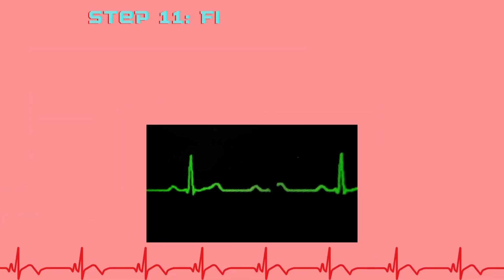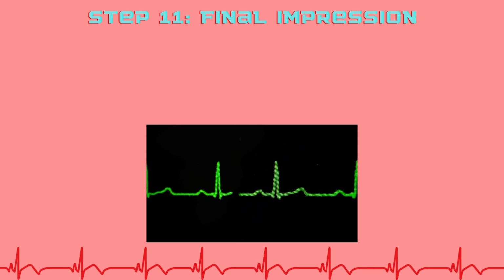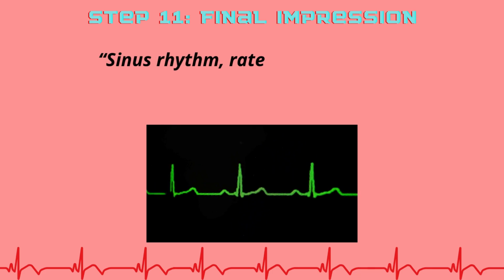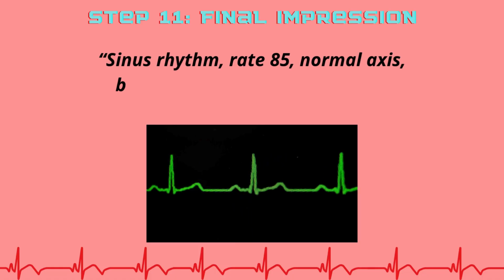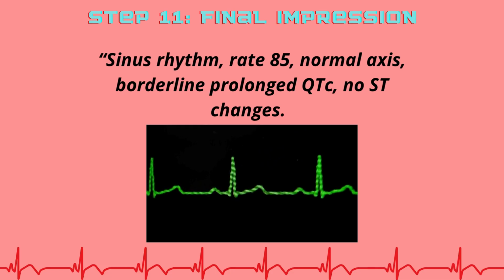And step 11 is your final impression. Summarize your findings in a short clinical statement. Sinus rhythm, rate 85, normal axis, borderline prolonged QTc, no ST changes.